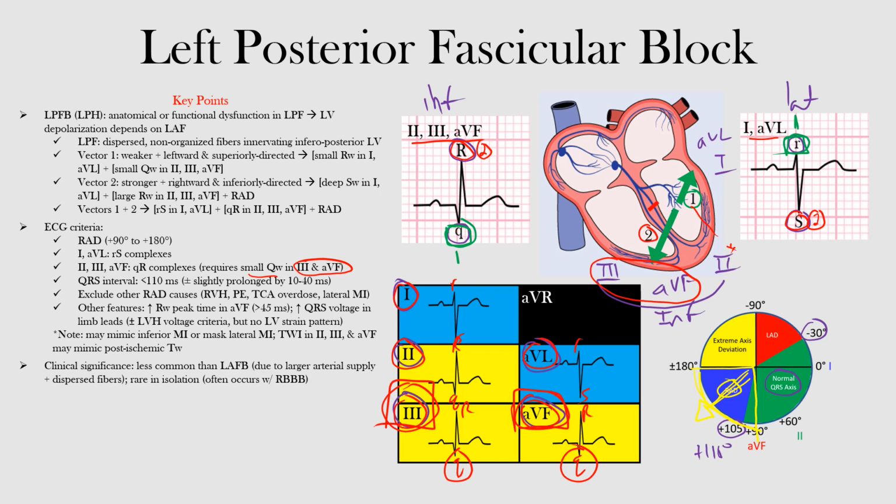Rather, this is a diagnosis of exclusion. Remember, and this is one of the main points we'll see here, you need to exclude other causes of right axis deviation. Now, just a few other points.